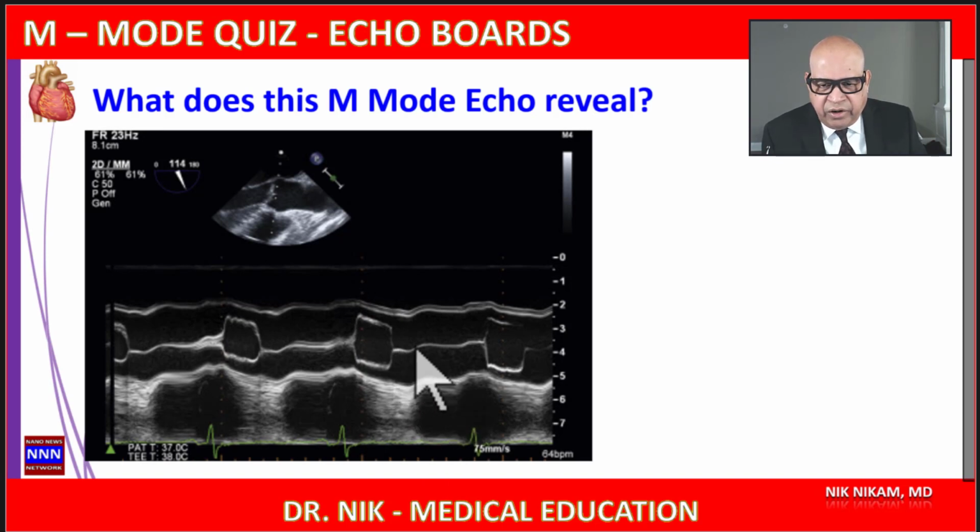Here you see the aortic closure is in the midline. That means this is an example of a patient with a tricuspid aortic valve. However, in patients with bicuspid aortic valve, we may see this eccentric closure of the aortic valve. Of course, that is not exactly right in modern day when we can get a 2-dimensional or 3-dimensional echo, which can give us a much better idea as to whether we are dealing with a tricuspid or quadricuspid or bicuspid aortic valve. All right, let's continue.